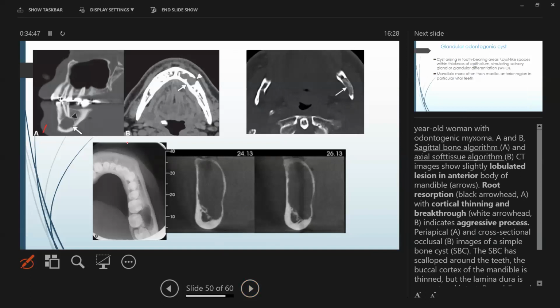And as I told you, these are the two important differential diagnoses I gave you, because this also shows the characteristic of expanding within the medullary cavity. This is odontogenic myxoma. Okay. So this is how it behaves, and it also will remain the same. But usually this odontogenic myxoma occurs in an older age group. Okay. Older age group. Or OKCs, they usually occur in the second or third decade. Okay, and simple bone cysts, they occur in very young individuals.